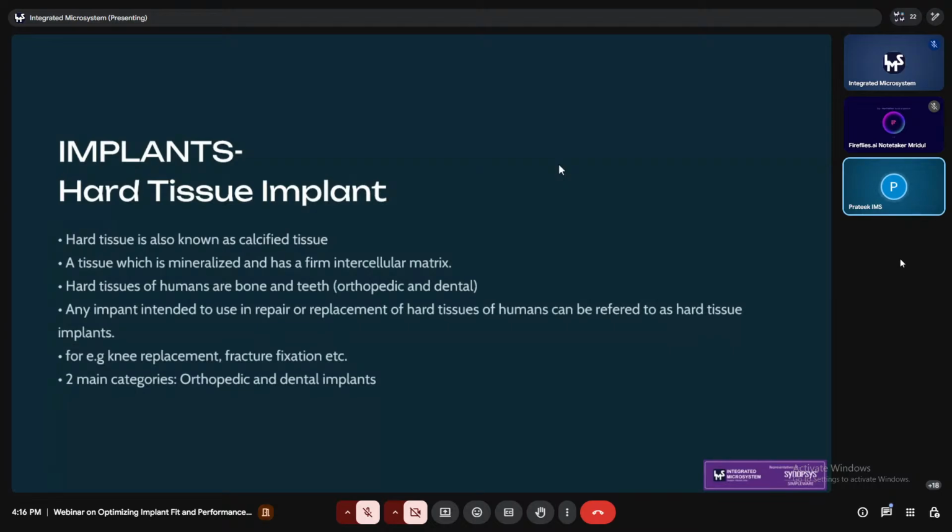When we talk about orthopedic implants, we have implants for the knee, the ankle, the hip region, the shoulder regions, and more. So we can directly work on the shoulder, knees, ankle, hip. So these are some capabilities that are available in Synopsys Simpleware. Directly, you can work on the automated segmentation and you can go for the implants.